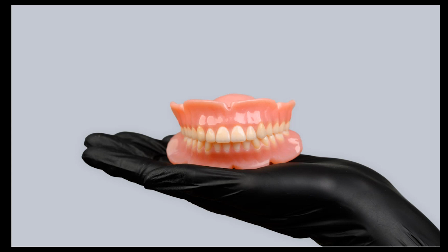Once we're done at this point, and you want to start applying the TrueVoxel shades, you select the dentures you want to apply the TrueVoxel shades to. If again you want to do more than one at the same time, you don't need to select the entire set of teeth in the same denture. You can select just at least one tooth of that arch, and same as before, hold Control to select multiple files at the same time. And now when you switch to voxel shades, you're going to see the entire arch switching to the shade you selected. So it's all going to be an A1 with TrueVoxel shades.